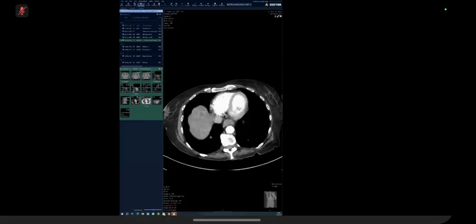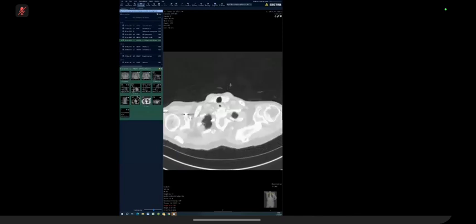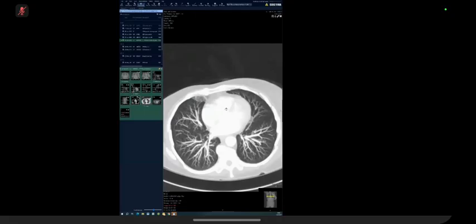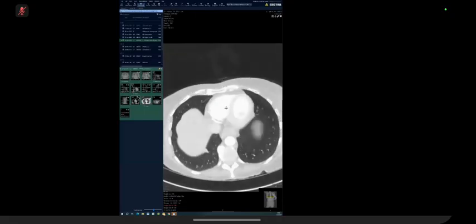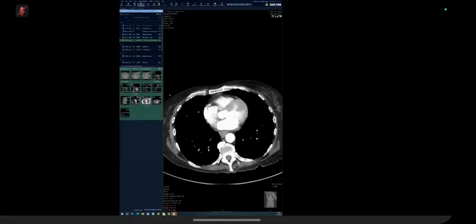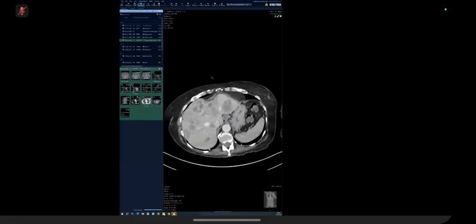I would like to look at the lung windows for any pathology. Okay, the lungs are normal. So I would still like to review the intestines, the colon specifically, as the hepatic mets could be. It's normal. Anything else you want to review other than the?